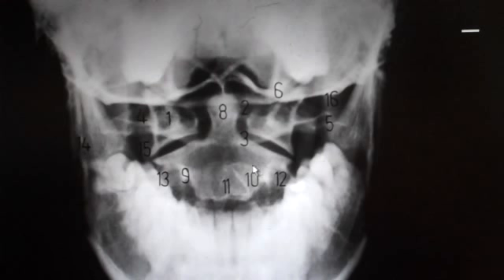That is the top of the lamina portion coming into the tip of the spinous process right here, and then the top of the lamina portion right here. So we do have vertebral body by itself here, whereas we have vertebral body and lamina right here. So number 10 is labeling the lamina of C2.